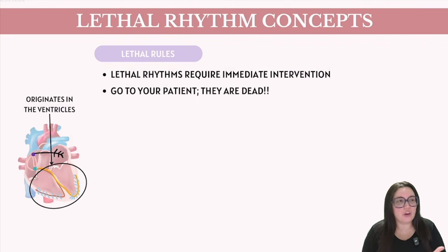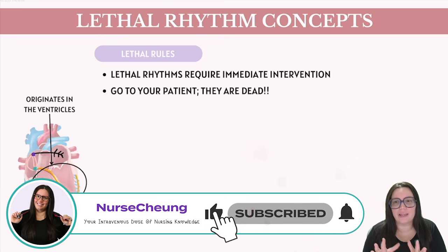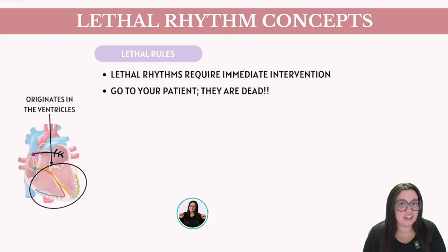So as always, we start with our lethal rhythm concepts. And one of the biggest things that I want you to know when it comes to lethal rhythms is you need to have immediate interventions taking place, because honestly, your patient at this point is dead. So let's go through the 3 different kinds of lethal rhythms that you're going to need to be aware of, especially when you're taking those ECG exams.